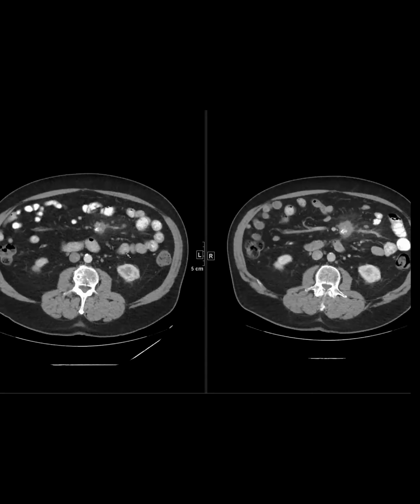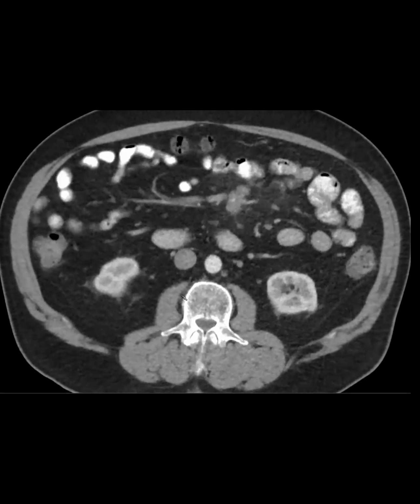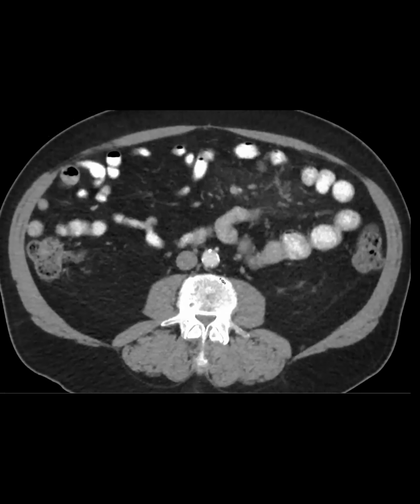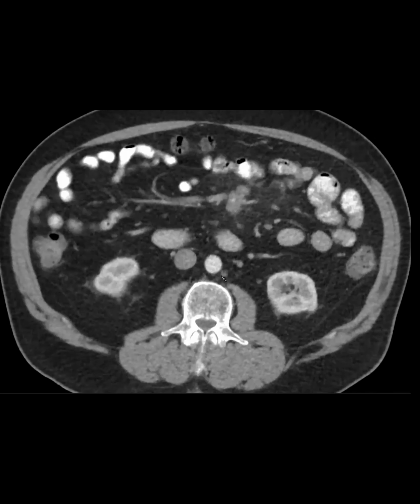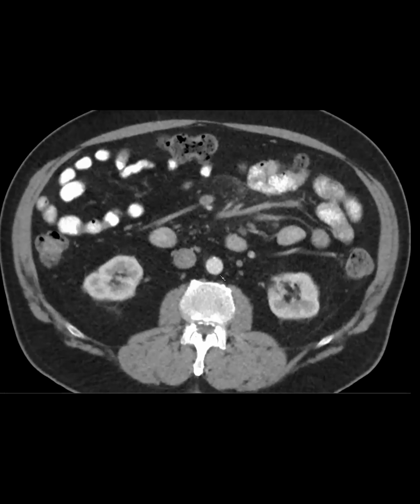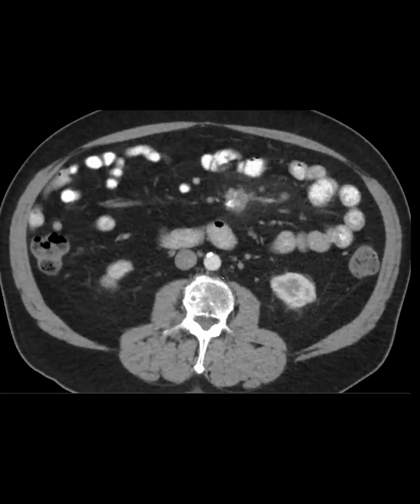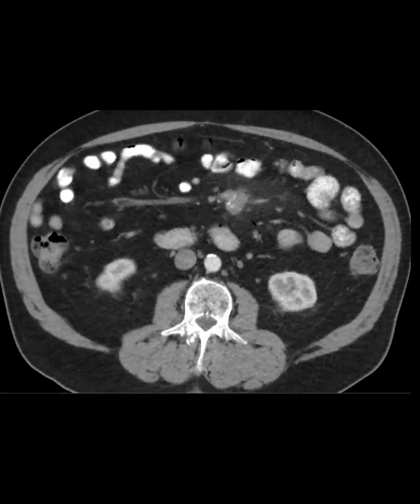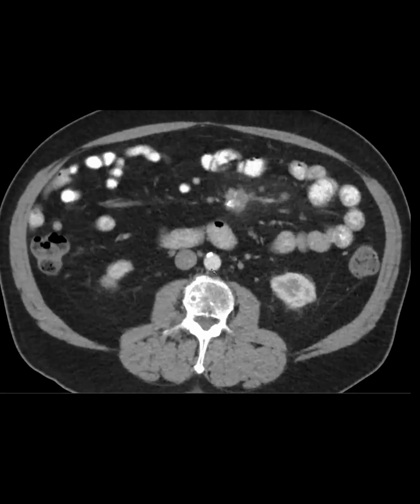Okay. This is a case of a patient who had this mesenteric mass with these small little calcifications in it. So what do you guys think? Carcinoid? Carcinoid is the top. Yeah, exactly. It looks a little ill-defined. It's got some dystrophic calcifications. It doesn't look so extensive.